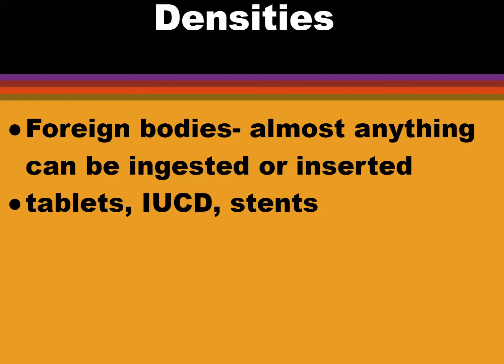Some densities are not abnormal, because sometimes tablets show up on abdominal x-rays, as do contraceptive devices and stents that we put into the abdomen. But some foreign bodies shouldn't be there. So let's have a look at a few.